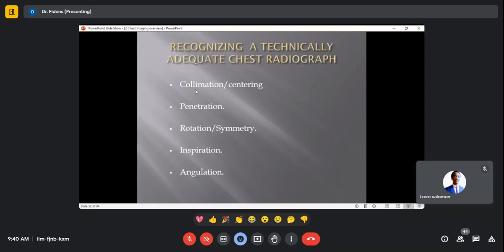You remember I told you upwards, you have to check if, sometimes they say, the C6, C7 level is in the film, or simply if the soft tissues of the neck are within the film. Okay, that's number one. Laterally, you check if the chest wall is in, the target being the chest wall within the film, but you can confirm it by looking at the shoulder joints to see if the shoulder joints are within the film.